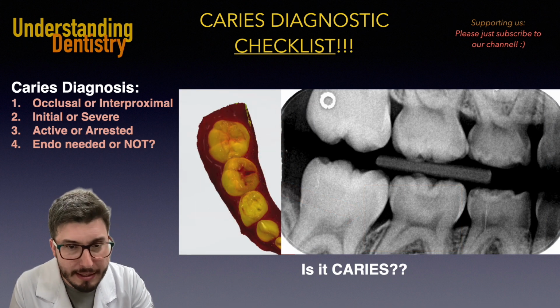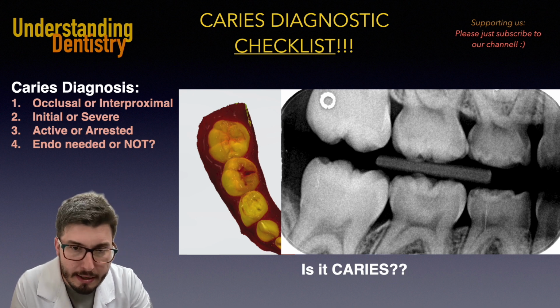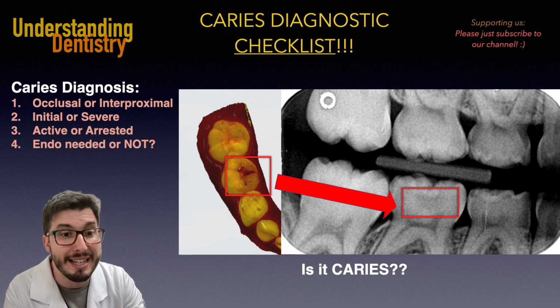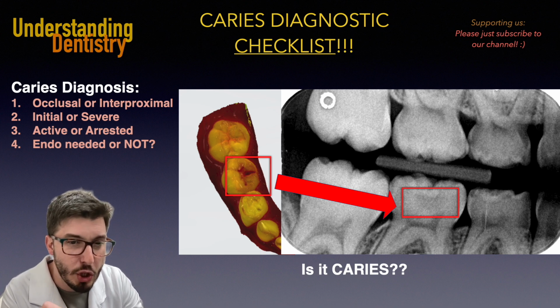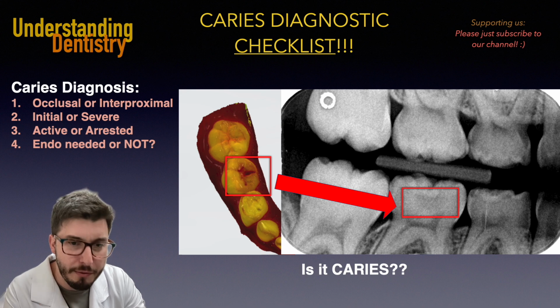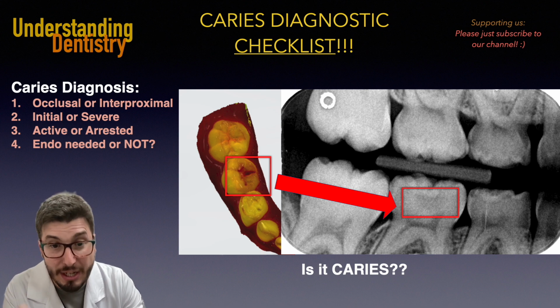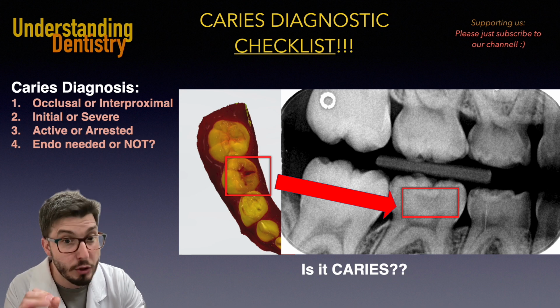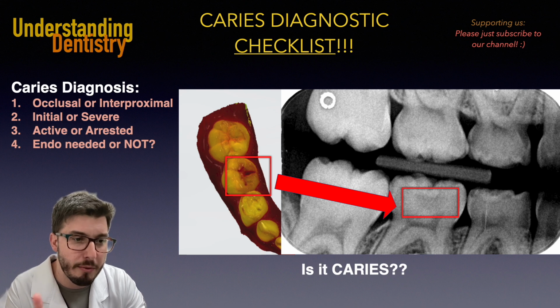Very good. So now let's see another situation here. So we have the occlusal caries of this molar, and then again, in this case, we are seeing now the extension of these caries. Even though the interruption of the enamel is not so clear on the radiographs, we are seeing, again, a very young patient, we are seeing the extension of this caries, and now it's even close to the horn of the pulp chamber, okay? So we need to be careful about that.